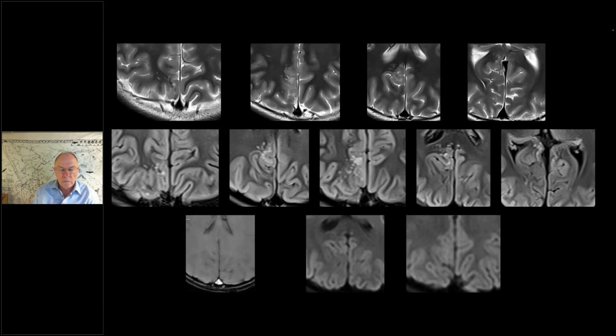Why can't it be simple hypoglycemic brain injury? This is usually bilateral and more posterior. Yeah, and cortical and subcortical also. I would not consider that further. But I think it's a kind of incidentaloma, whatever you call it. Yes. It has nothing to do with his presentation and with his dysmorphism and stature. And Noonan is, as we have seen, genetically heterogeneous.